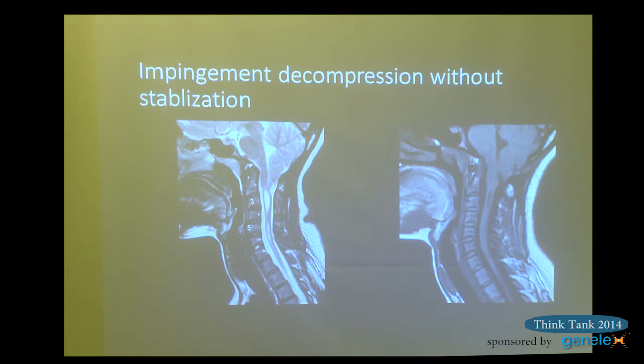This person had a decompression without stabilization and continued to have a syrinx and was continuing to have headaches and visual issues. The clival axial angle was never fully corrected due to the lack of stabilization.